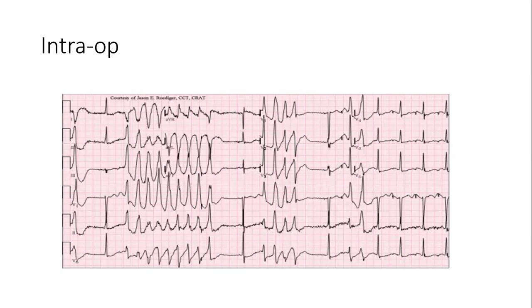You can find us another picture, Janelle, and I do agree with you, sometimes the pictures of ECG are never really the same. You do see that twisting pattern here, but you can find us another picture so that other people can see how else it can look.